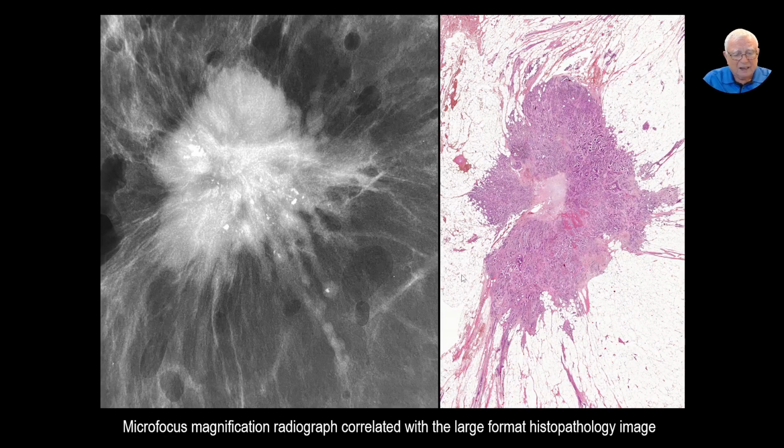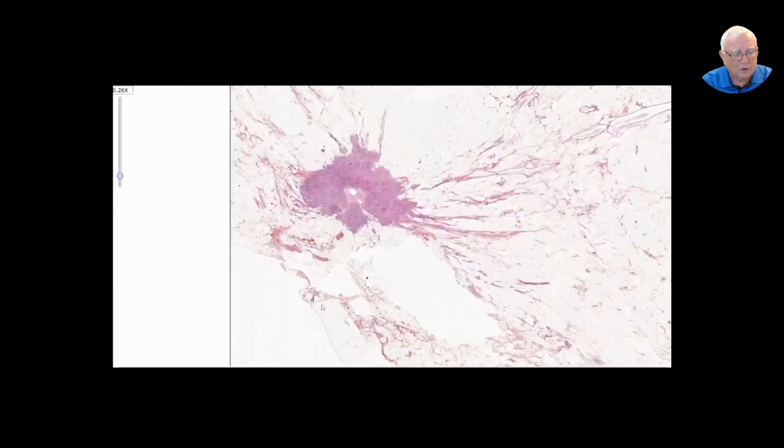Good pathologists describe this in their report. When we are photographing the slice specimen and also magnify it, then we see these malignant type calcifications. No doubt about it that this part is the dedifferentiated, and this is the mother. We are going to try to chase that too.